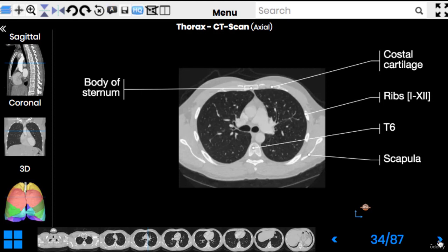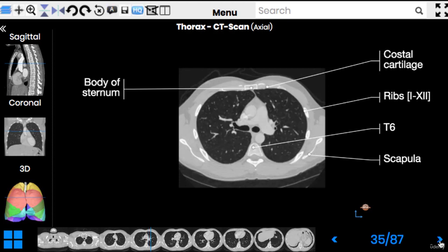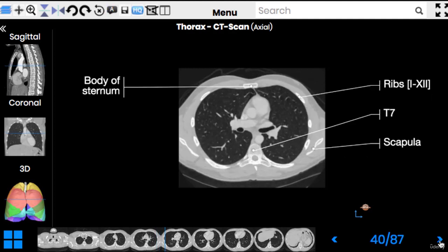And now we have two main bronchi in front of our eyes, the right main and left main bronchus. And again, you see the course they take is slightly different on the right and on the left. We have a more horizontal direction on the left side and a more vertical direction of the bronchus on the right side. These protrusions on the right and left sides, you see now, are the roots of the lungs.